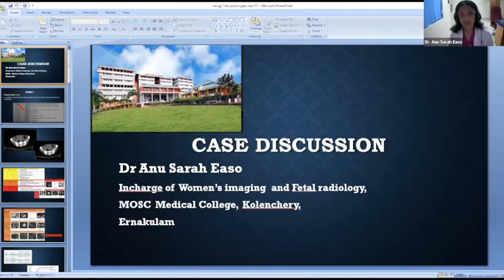So as you said, the other T1 hyperintense lesions can be a hemorrhage, which in the early subacute phase, or in the late subacute phase, can appear hyperintense on T1 and T2. So it can mimic a fat-containing lesion. This is the signal intensity curve for high, intermediate, and low risk. See, in the high risk curve, the early part of enhancement is more than the myometrium.